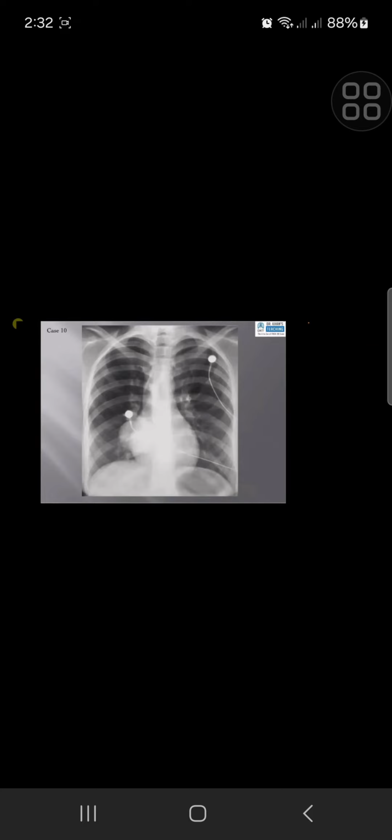So I've got an anterior chest radiograph of an adult patient, and the most striking abnormality is that there's a round density within the right lung at the medial aspect. Looking at this density more specifically, the right heart border is clearly seen through this density. So this is not an anterior mediastinal mass. And the right hilum, the inferior aspect of it, is also seen quite clearly through it. So I'm happy that this is not a middle mediastinal mass. So I've got a posterior mediastinal mass within the right lung. This has a wide differential.